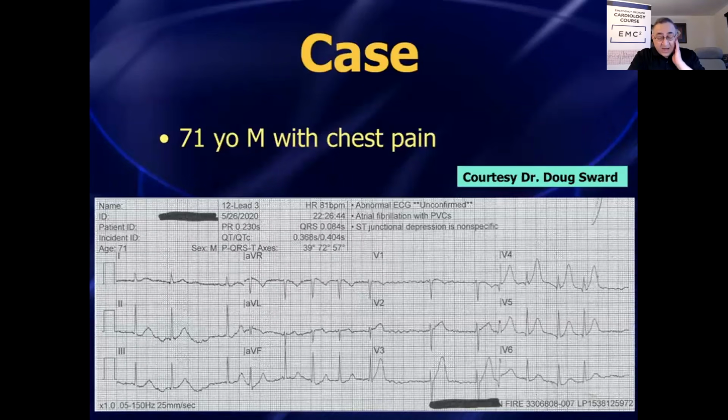Here's one from one of my colleagues, 71-year-old with chest pain. Take a look at this and tell me what, or think in your mind at least, what lead would you worry about here?